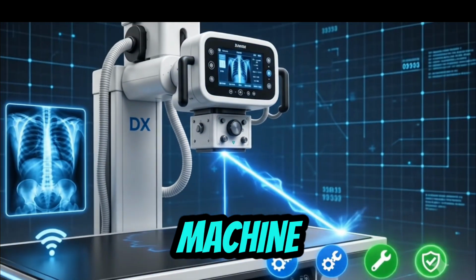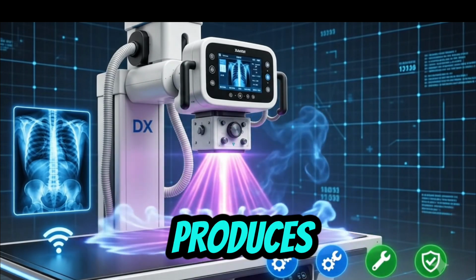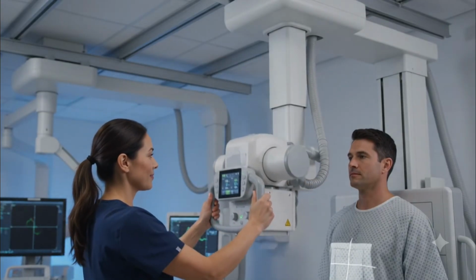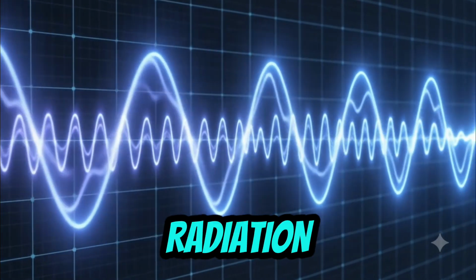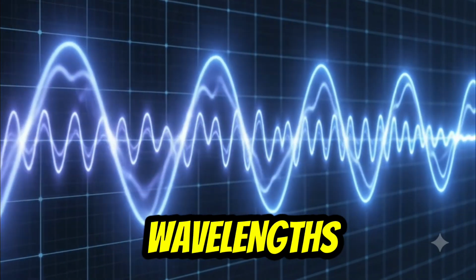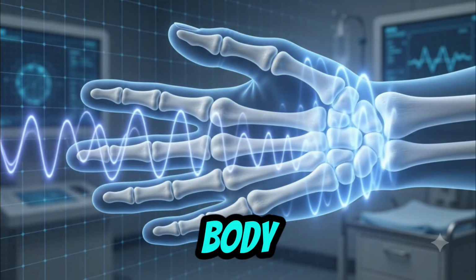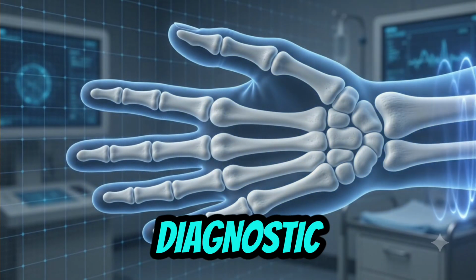An X-ray machine is a medical imaging device that produces X-rays to create images of the human body for diagnostic purposes. X-rays are a form of electromagnetic radiation with very short wavelengths and high energy. These properties allow them to penetrate the human body and produce detailed diagnostic images.